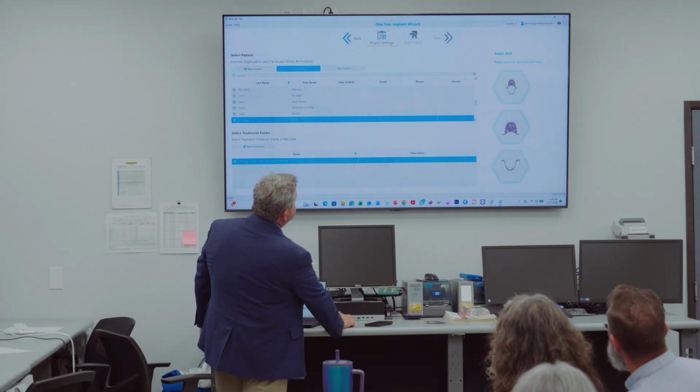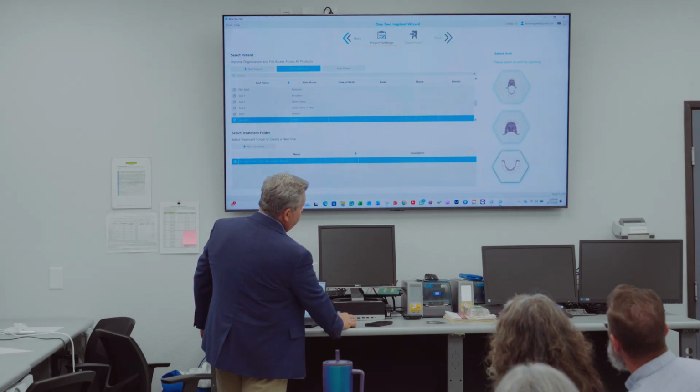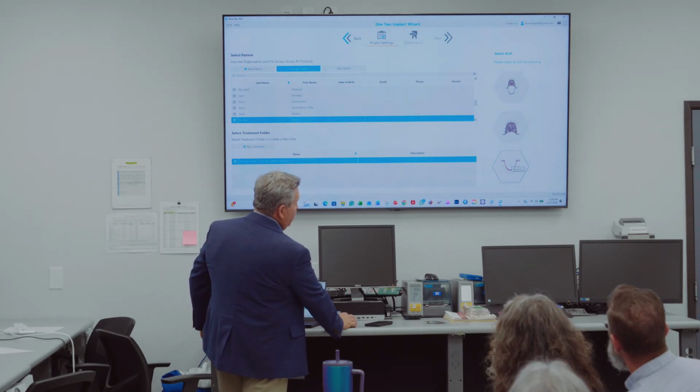And get used to the buttons up here, next. There's the next button, okay? But first, like I said, we're gonna do the case that Corey just did. We're gonna go through it again while it's fresh in your mind. We're gonna do the mandible case. So you have to click on mandible, and then click on next.